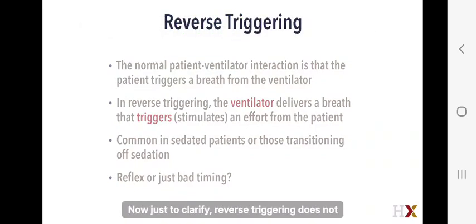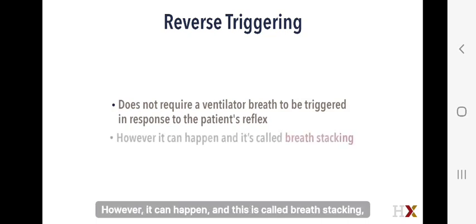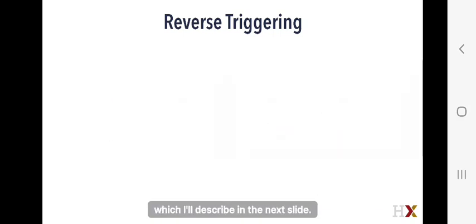Now, just to clarify, reverse triggering does not require a ventilator breath to be triggered in response to that patient reflex. However, it can happen, and this is called breath stacking, which I'll describe in the next slide.